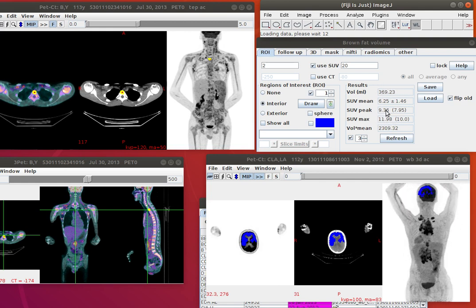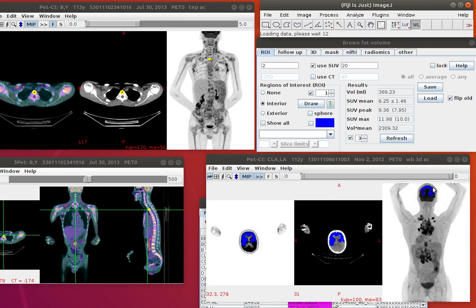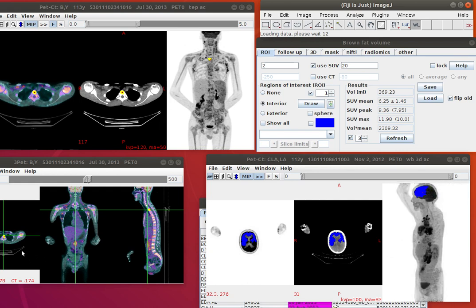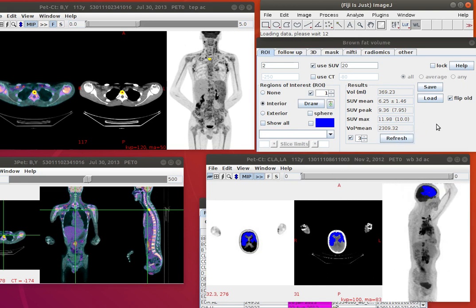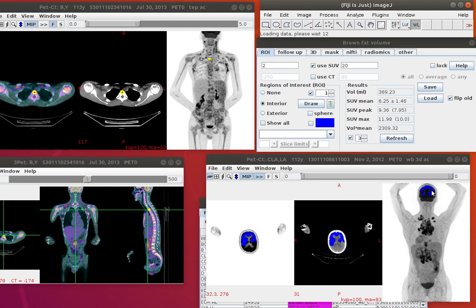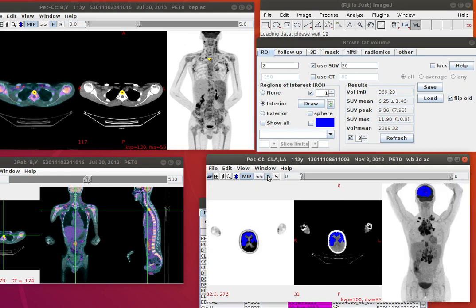The values have changed, and the study which is being shown in blue dots, and the previous study is in yellow. So what is showing in this brown fat is always the blue, and the old studies are yellow. Okay, let's do the same trick here.